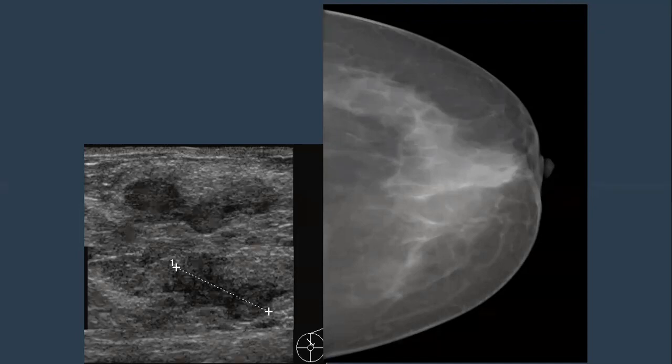Does the papilloma cause architectural distortion? Usually this occurs with intraductal carcinoma when it becomes infiltrating. Does it look like invasion?